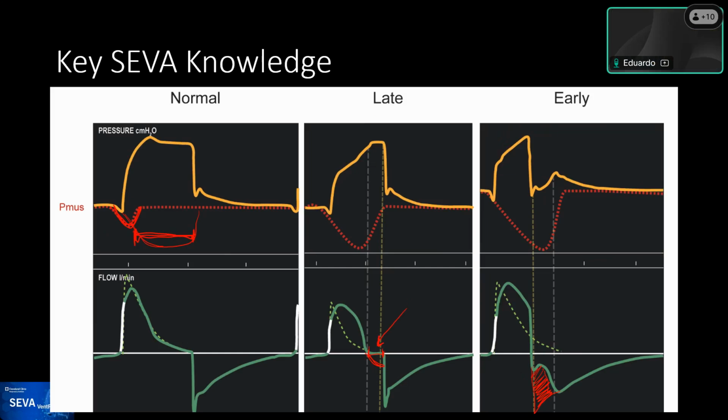And that's one of the challenges, right? In which you're saying, well, how can this be normal and this be abnormal over here? And in this case, there's muscle relaxation, but if it's pushing out during inspiration, that's a patient that is doing effort against the ventilator, right? Very tricky. This is why we need to get better definitions and align ourselves on what matters and what doesn't matter, and when it becomes an issue and when it doesn't. Any other comment, Rob? No, sir.